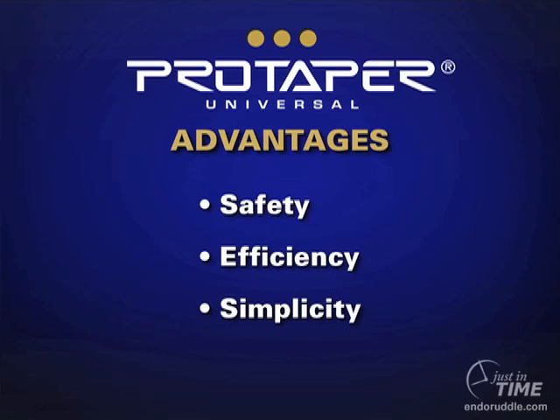There are many advantages to the ProTaper files, but first of all, anytime you change the taper on a single file, it improves the safety of the instrument. In fact, it makes the instrument safer than all similar sized instruments, because fixed tapered instruments tend to be a little bit more grabby, but by changing the taper, you have a very small engagement zone and instruments don't tend to screw, and breakage has been shown in different Journal of Endodontic articles to be lower in a changing tapered instrument.